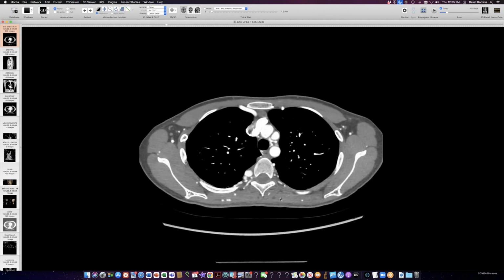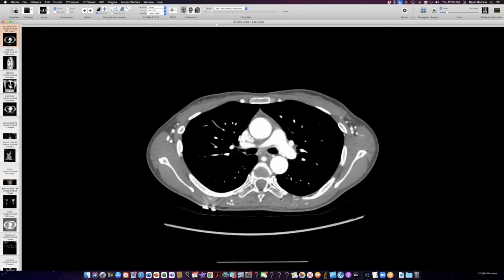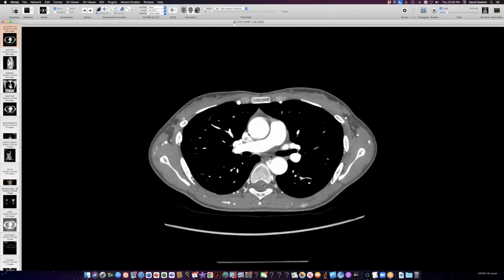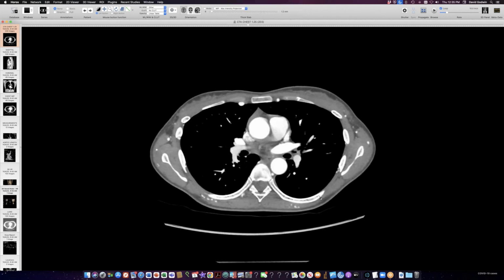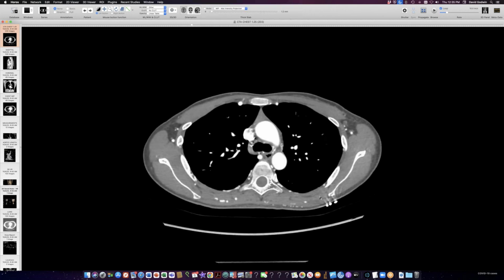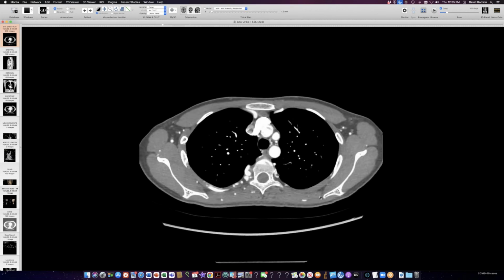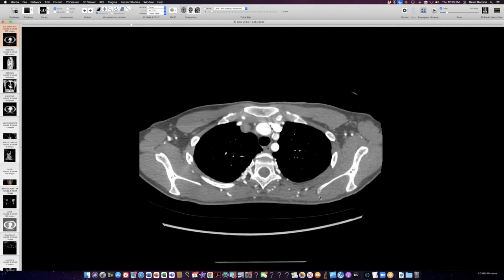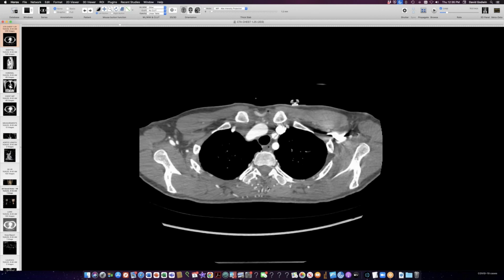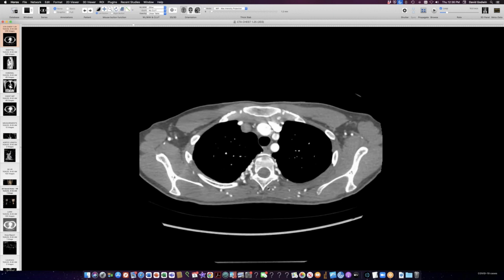Let's go back to cross sections here and let's look at these chest wall collaterals. So lots of collaterals here all over the chest wall, and a lot of stuff snaking in here to feed these posterior intercostals and then get blood. Yeah, and anteriorly, like the descending aorta here. So we've got vessels all over the place. And this person is entitled to have rib notching.